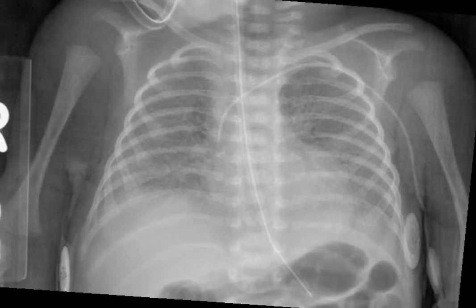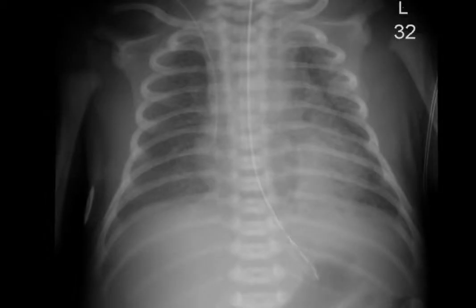There's a different patient with the same problem. There's an oval or rounded lucent area in the right suprahilar region, focal interstitial emphysema. There's another patient with the same problem. In this case, it's very medial in the left lower lobe, paraspinal. This was persistent on multiple films and is an unusual collection of coalescent interstitial emphysema in the left lower lobe. He may have other areas in the mid-lung field as well.